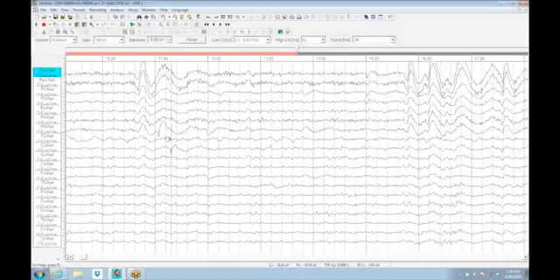If you have a generation of a voltage like this, it'll be seen at the adjacent electrodes. It'll have a field surrounding it, with a phase relationship, and that just doesn't exist. So this at F8 and this at C3 are individual isolated electrode pops.